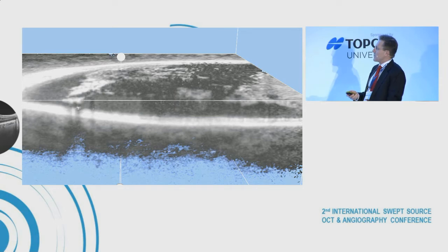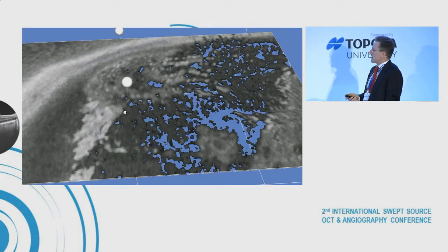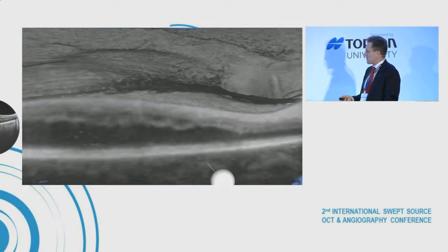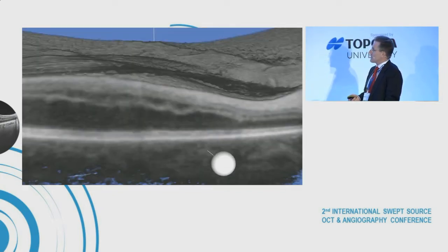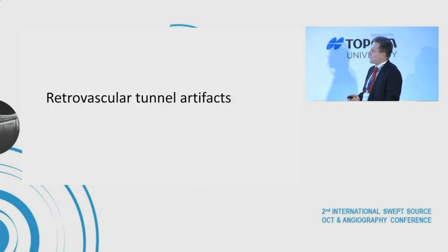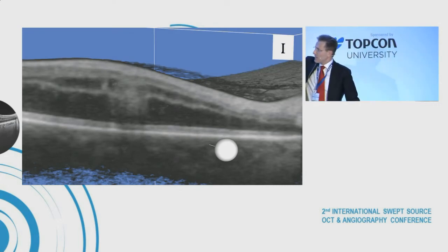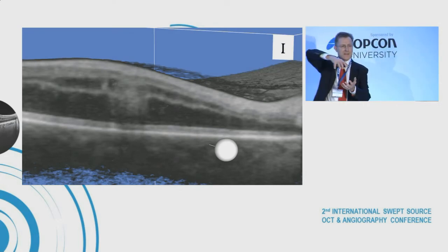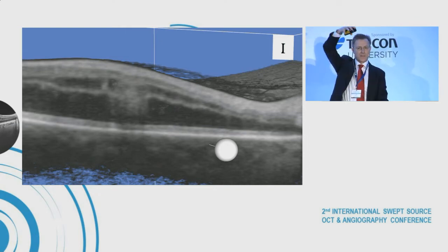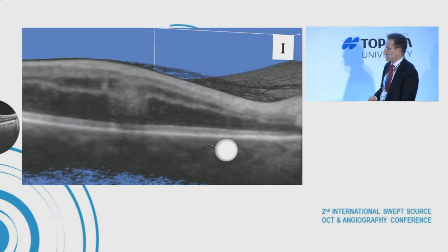And we can have a look at it in a transection from both sides, where the aggregate is down below, and we can creep under the carpet, so to say, and move through the cysts, and then you'll see there in the middle of the picture that again the exudating tuft or bundle of vessels is extending deep down into the outer nuclear layer.